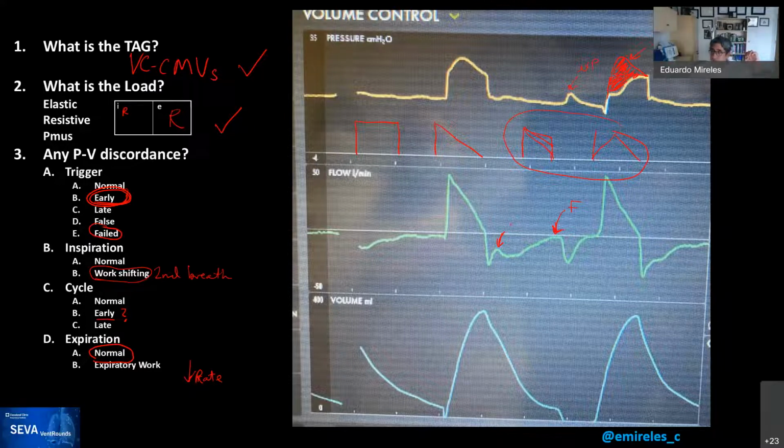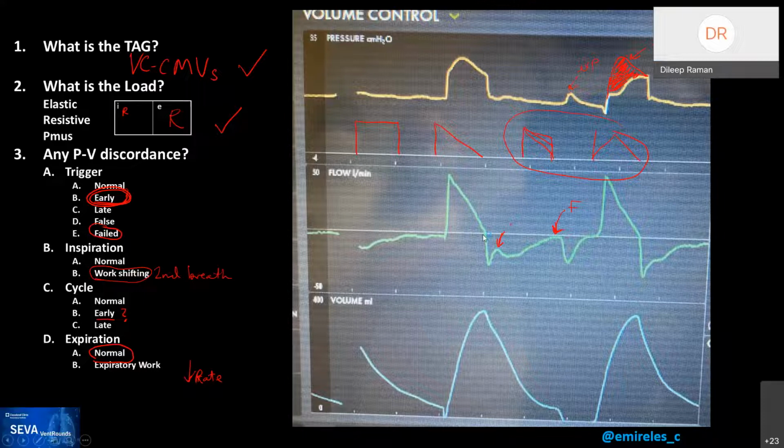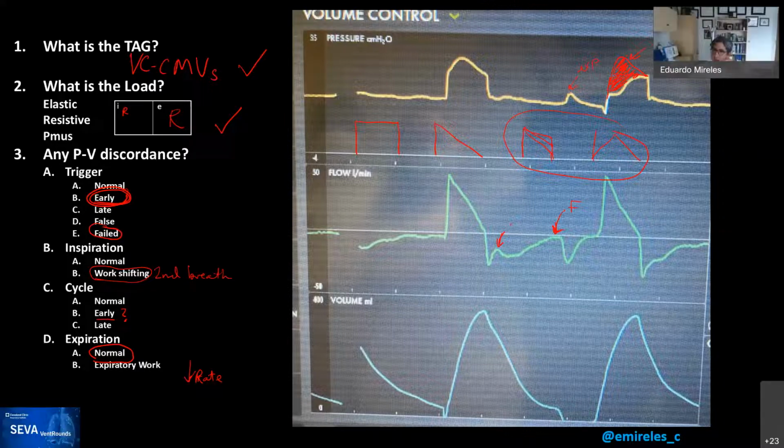Thank you for that. My question was mainly because I was wondering if on a decelerating ramp you could have dual active at the same time. And that's related to Juan's question there, that could this be a reverse trigger that we're seeing in the middle of the first breath? I agree IMV is not likely from this waveform, but I was just wondering if dual can be active at the same time as a decelerating ramp, and Rob says no. So that answers my question. So can you have dual active with decelerating ramp at the same time?